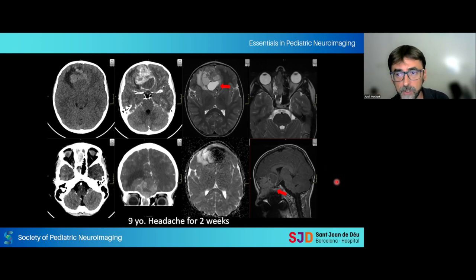But there are also other tumors that can affect the nasal cavity and the anterior cranial fossa as well. One of them can be Ewing sarcoma or aggressive soft tissue sarcomas, but this is not the case. This is a right-sided mass arising from the nasal cavity, eroding the skull base, so the cribriform plate, and extending into the anterior cranial fossa. You will see both components, the vasogenic edema here.